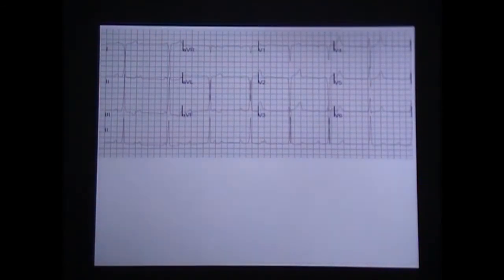That's what a lot of people do. They get their first impression and just run with it, wipe out everything else. So what was I looking at? The QRSs don't appear to be widened. Okay. Like I said, the P waves appear normal, they just don't always seem to be corresponding with the QRSs.